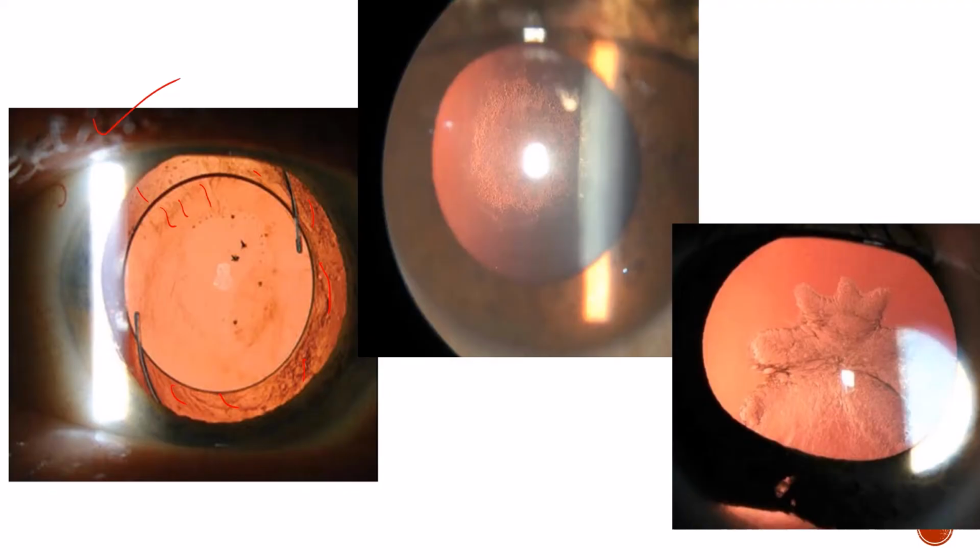That is what is seen on your retroillumination from the retina. Now in the second picture, you can see this is a normal lens, and however here you can see certain opacities coming up on the retroillumination. Okay, you can see the beam is on one side of the pupil, and then from the retina we are getting that back glow, fundal glow. So this picture actually represents a presence of posterior subcapsular opacity, okay, which is opacification below the posterior capsule of a normal lens.